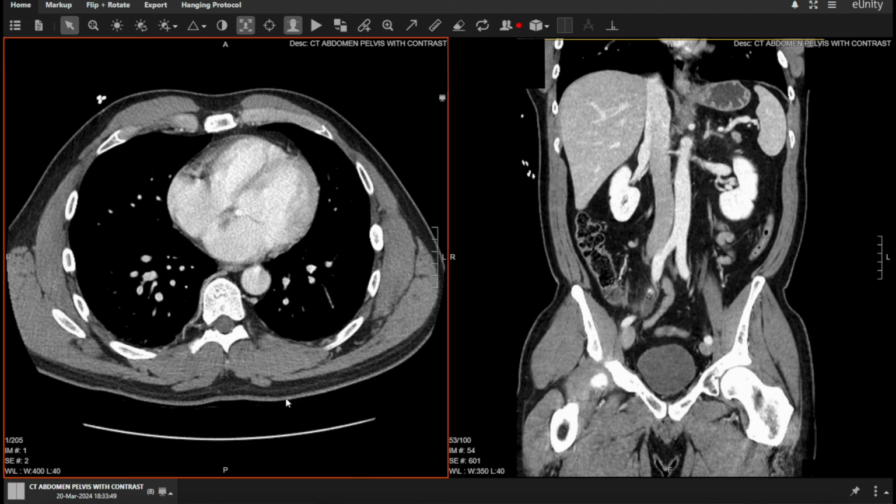This patient, as you can see, is lying on their back, and their feet are actually coming out towards you out of the screen, and that makes this right actually left and the left actually right, and you can see that it's labeled with little R's and little L's. It is thoroughly confusing, though, and it requires some mental gymnastics in your brain to sort out right from left when it's switched like this.